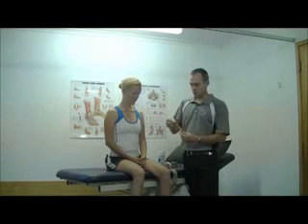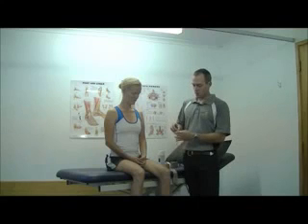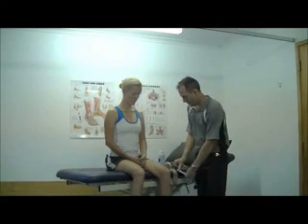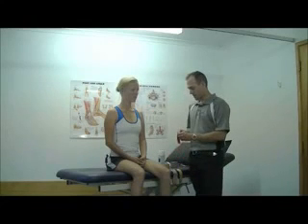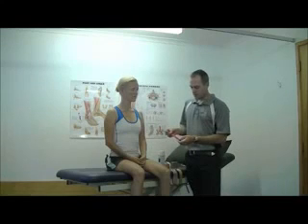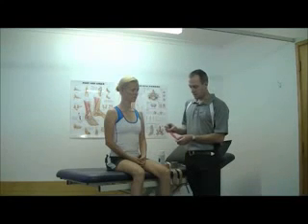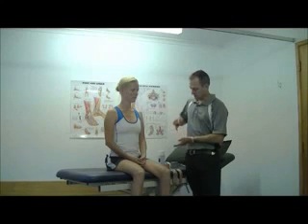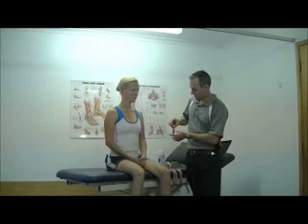If we compare that with our rigid sports tape, which I'm sure you're all familiar with, this has no give at all in either direction. And if we compare it to a kinesio tape, we see that kinesio does have some stretch, but it has a definite end point and becomes rigid once we stretch to that point. It also only stretches lengthways. It doesn't have any stretch transversely.